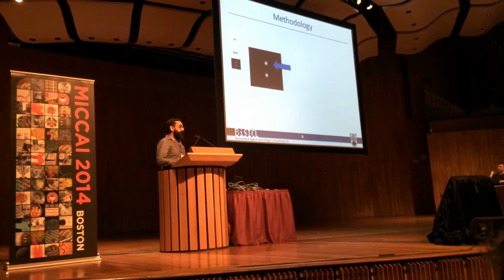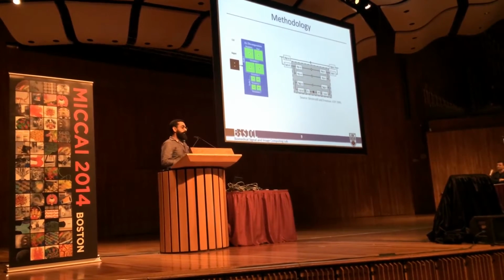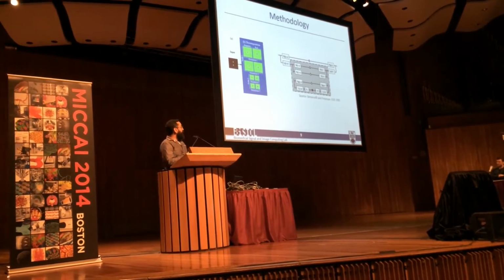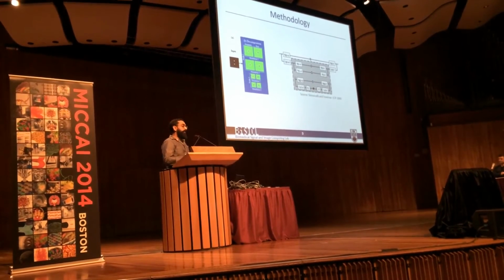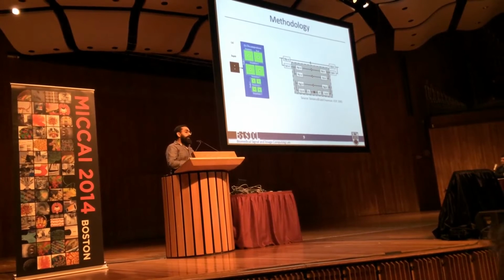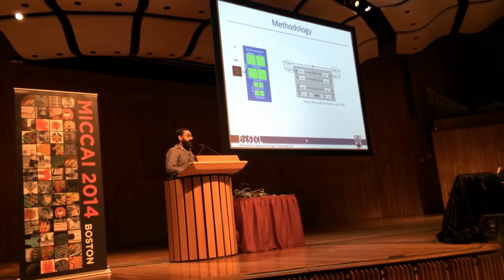So to measure local phase, we use the following decomposition proposed by Simoncelli and Freeman. The recursive block diagram is shown to the right. And after applying these filters to every frame of the original video, we can extract local phase and local magnitude from the complex filter outputs.